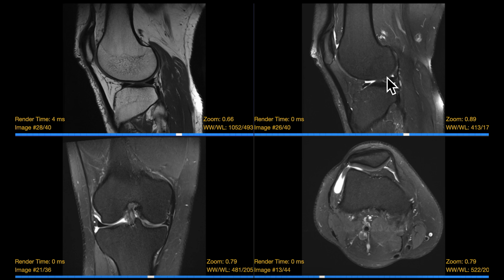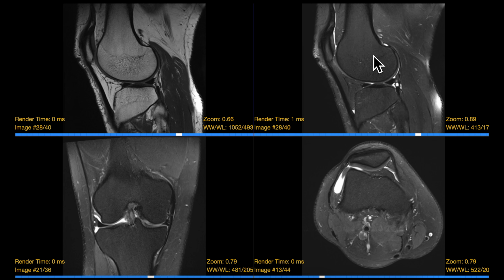This is important because certain injuries, for example, a lateral patella dislocation or a pivot shift injury with an ACL tear, tend to have a predictable pattern of contusion and bone marrow edema, and sometimes even a predictable pattern of fractures. You can also see bone lesions, and sometimes they may be just confined to the bone marrow itself, or sometimes they may be in the bone marrow, distorting the cortex as well. So it depends on what kind of bone lesion you have.